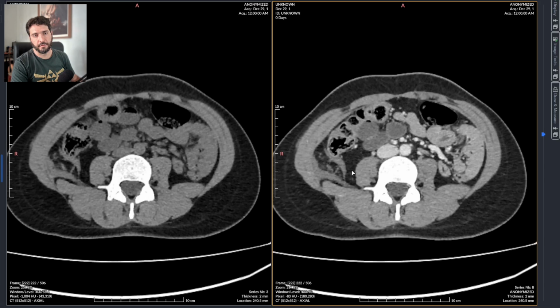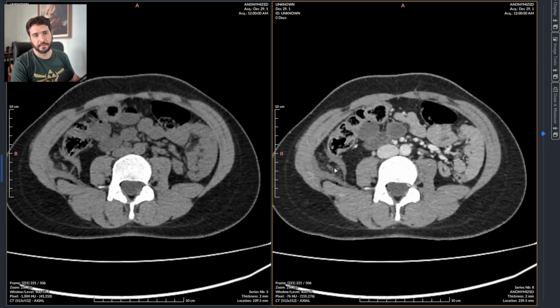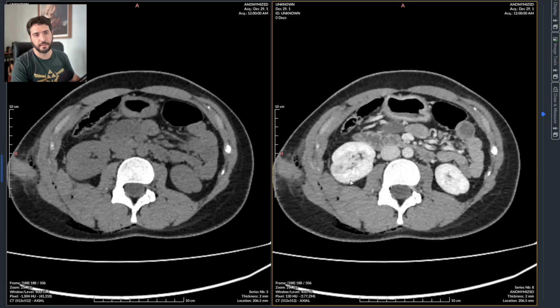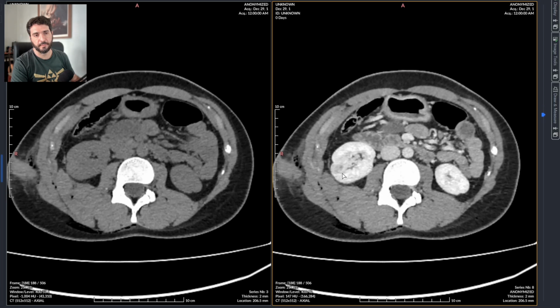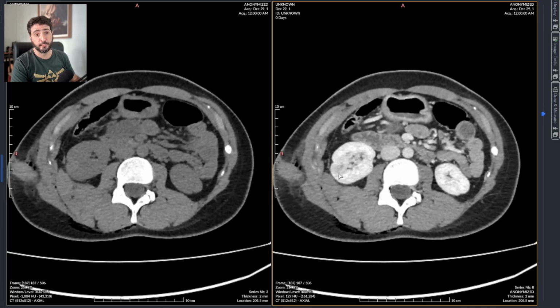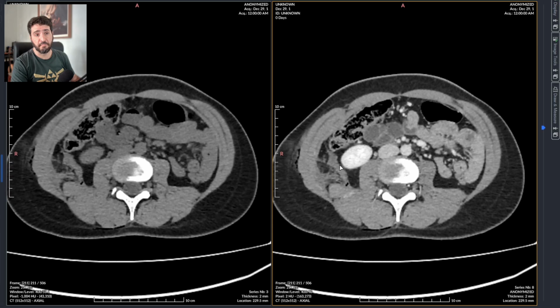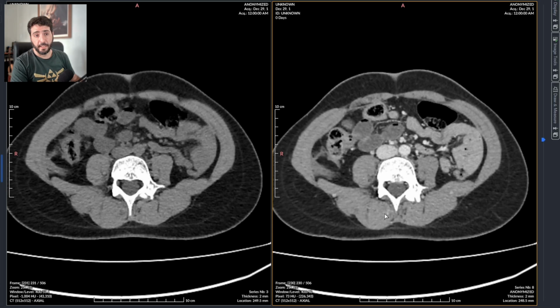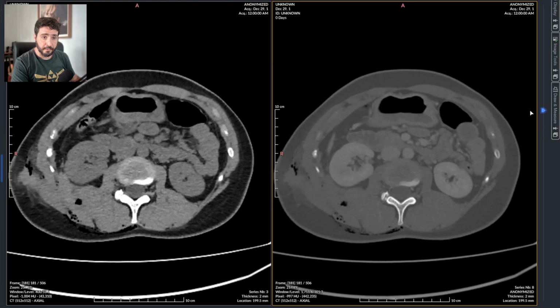So the kidney fat tissue, the extraperitoneal fat, is densified, which means there is blood right here, but the kidney itself is pretty much normal, just a bit of maybe a burn wound due to the proximity of the actual trajectory of the gunshot. So this is a very minor lesion to the kidney, and it doesn't look like bone was hit.